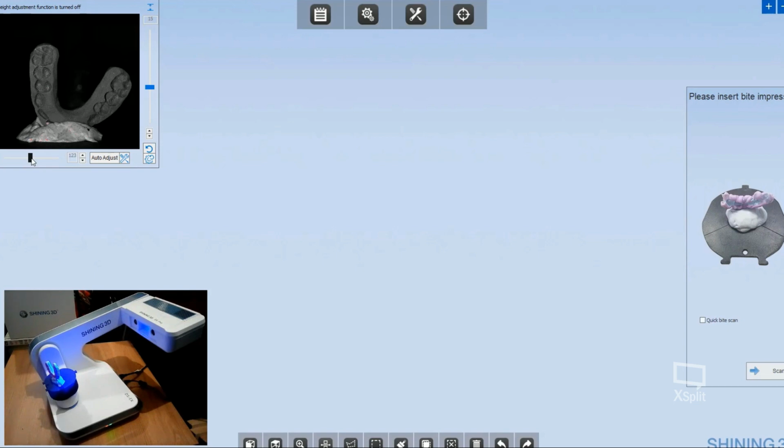You know that every kind of environment has light pollution, and for optimizing the acquisition of this object in every kind of environment, we have implemented the possibility to set the camera's exposure manually or automatically, by pressing Auto Adjust. Once everything is set, I can start my acquisition.